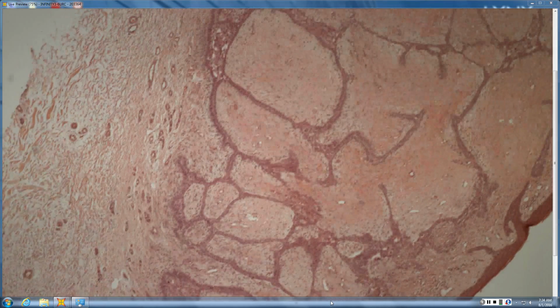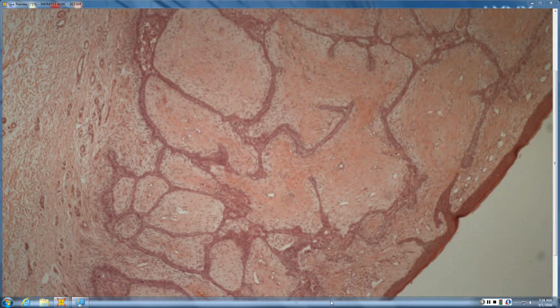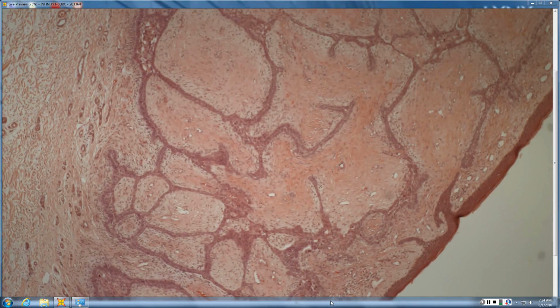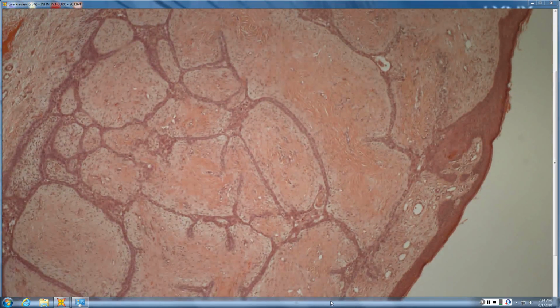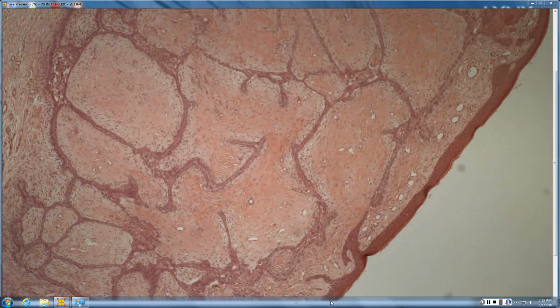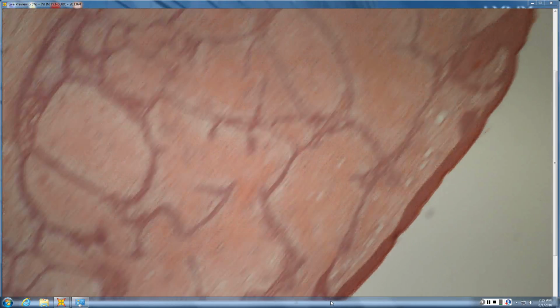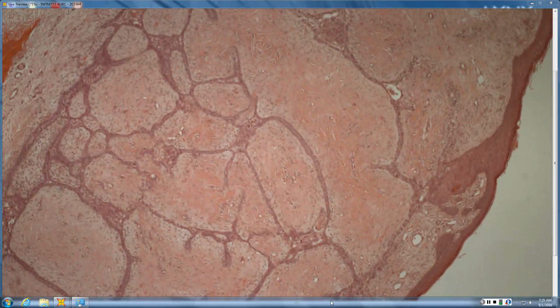Okay. So Shane, what do you see here? Well, let's see. Pink strands with a very anastomosing pattern, or maybe ducts inside. There are some ducts inside. So this would be what I would be saying. So you said Pinkus? Okay, very good. Yep.